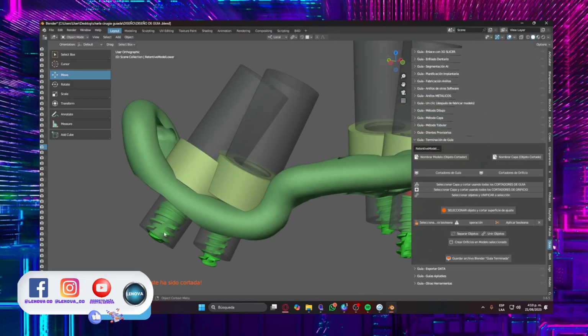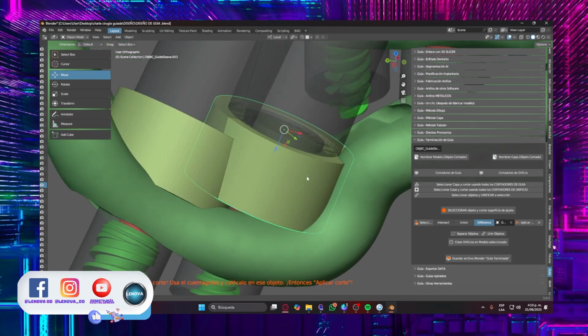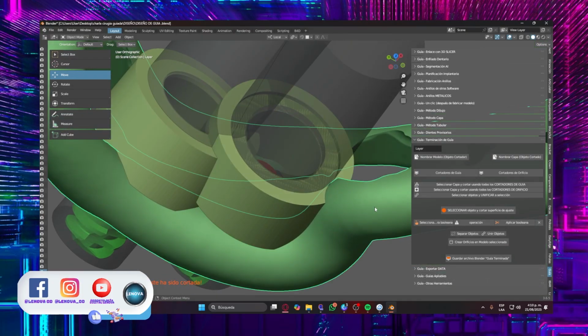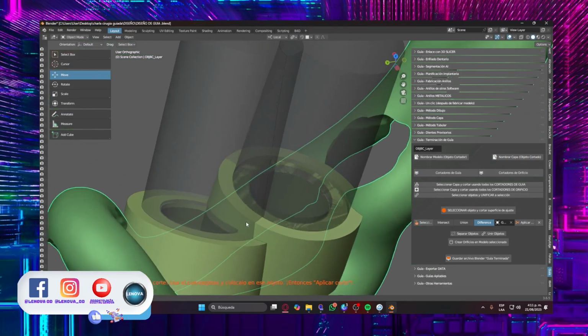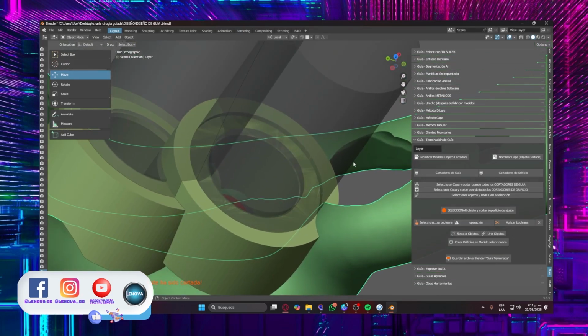I'm going to do the following. I'm going to select the drum, check the option to select elements for Boolean, and with the dropper, I'm going to select this external shadow. Notice that I marked the external area. If it looks like this, I can immediately mark cut and nothing will happen. If the guide is being affected in this area, we can do the same exercise. Select the guide, select elements for Boolean, and with the dropper, the external shadow to cut that small area as long as the guide interferes in those spaces. Now, since I finished using it, I can hide it, okay?